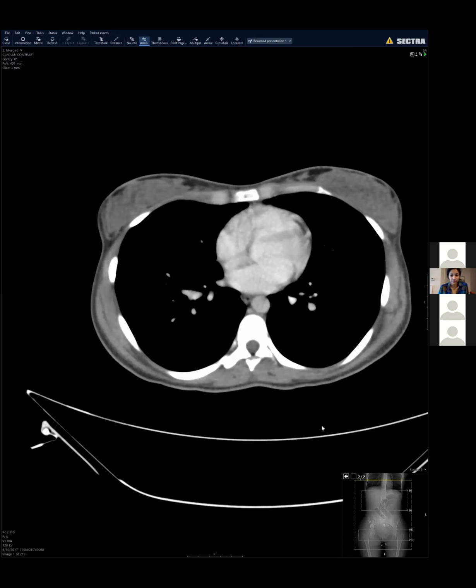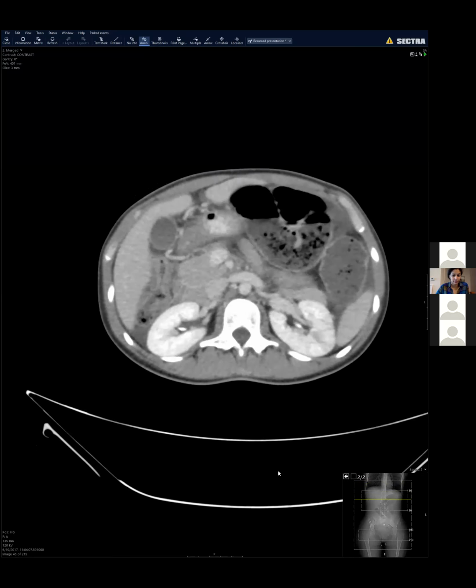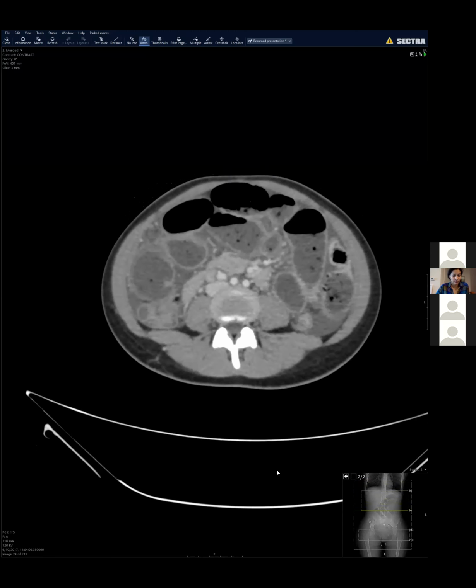So as always, CT scan has all the answers. Here's her CT. And if there are any trainees in the audience, just always remember to look at your scout radiographs. The thumbnail of the scout here shows dilated small bowel loops. So we're thinking of some bowel problem, especially given her history. As we scroll through the CT, some trace perihepatic fluid, beginning to see those dilated small bowel loops, lots of air fluid levels, fecalization.